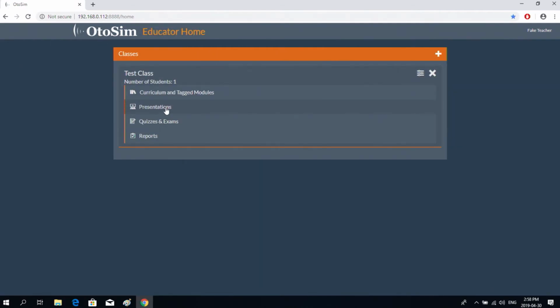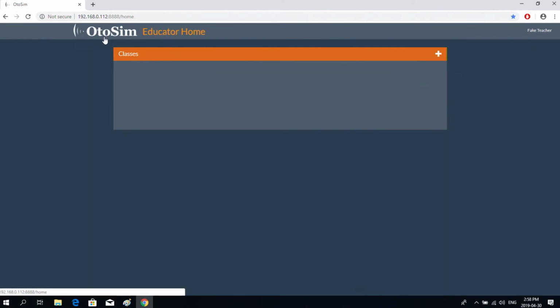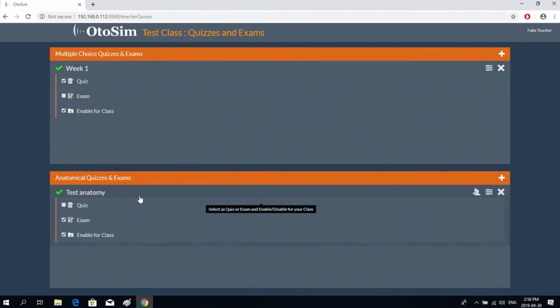I created a presentation called Test Class and enabled it, and we viewed the presentation on the videos on the student side because it was enabled. And I created one quiz called Week 1 and enabled it for the class. And I created an exam called Test Anatomy and enabled it for the class.